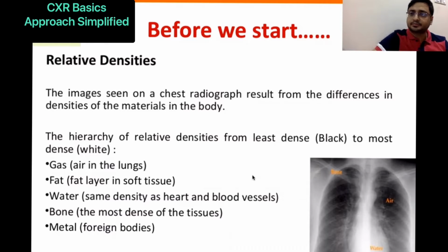So chest x-ray is an important aspect of medical examinations where we can see a lot of structures through chest x-ray and through its different views and can diagnose a lot of disorders. It's now a basic and primary mode of investigation, and one of the most important examinations.